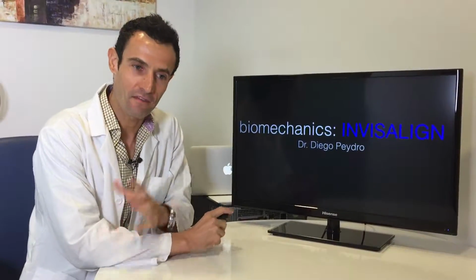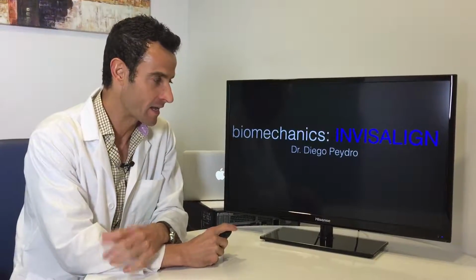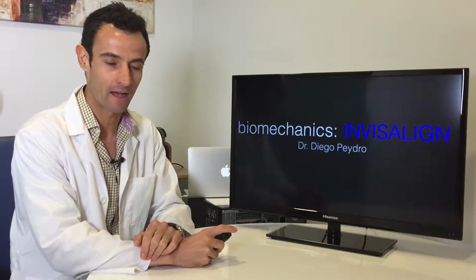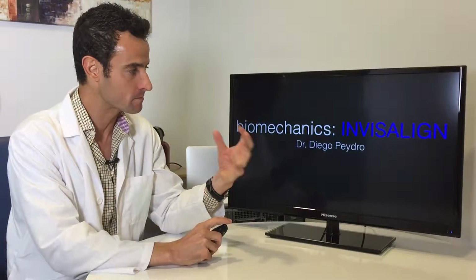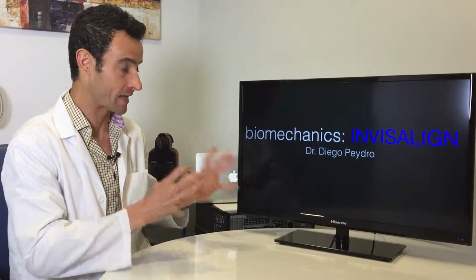Hi to everybody, thank you very much again for being here following my videos, and again I want to share with you a clinical case where I want to show you my process of thinking when I do a planification of a case with Invisalign.